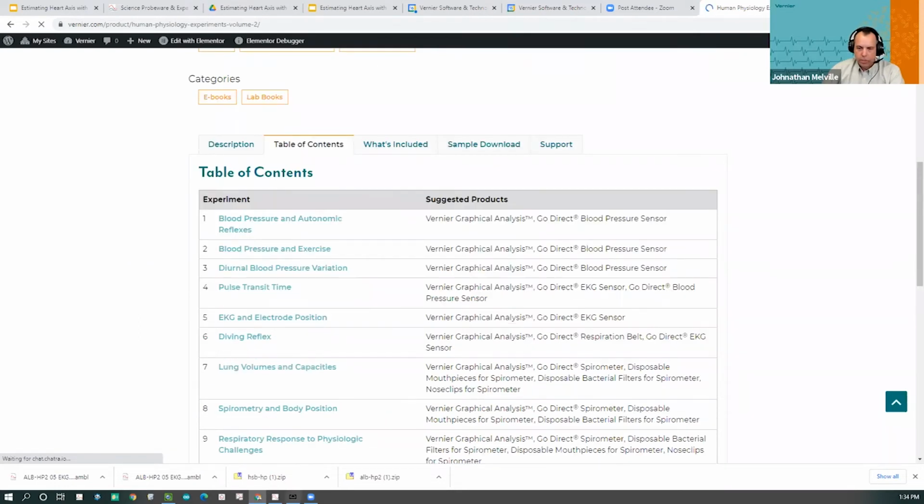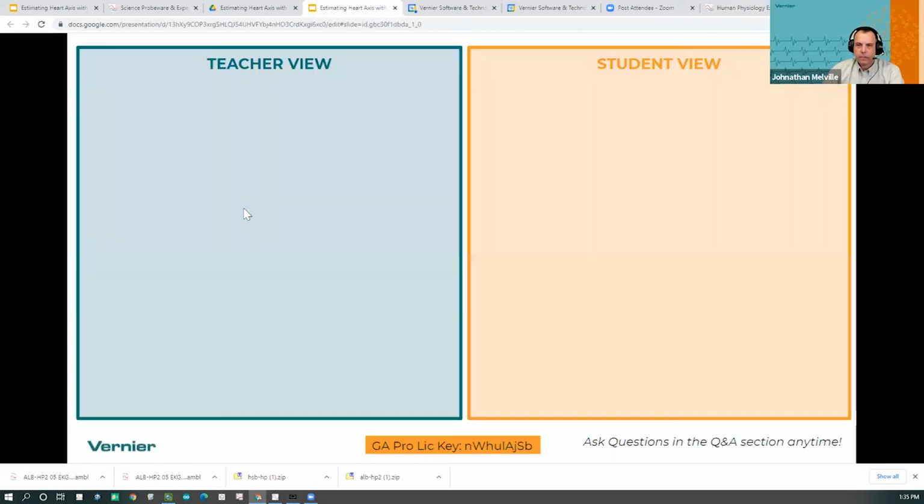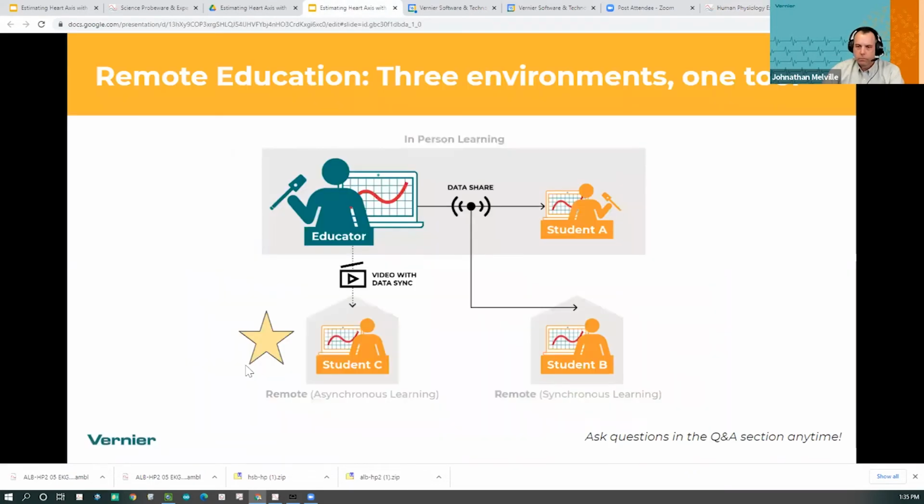Other questions on GA Pro? Graphical analysis. I can show you how to insert a video. Before I do that, why don't I show you a couple of things that most teachers think are really important to take a look at here in GA. And that's, hold on here. Let me bring GA to the front. Hold on.